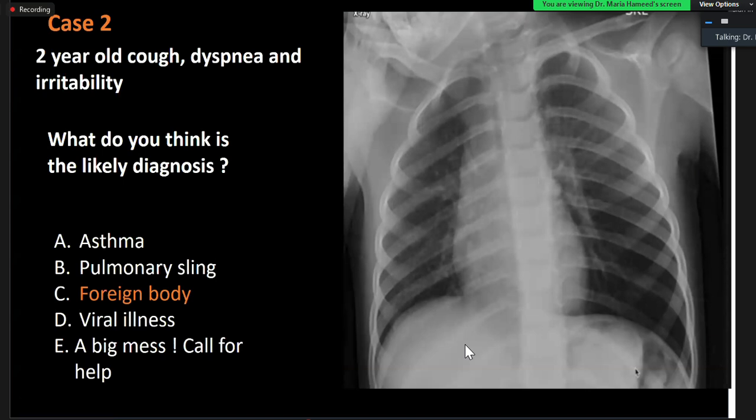But besides that, there is gross asymmetry, so you need to look for that. Here you see there is smaller lung volume on the right, and the left lung is bigger and much blacker. And how about the vessels? All the vessels are very much smaller in caliber. Again, there is some mediastinal shift. All these findings reflect that something is resulting in air trapping.